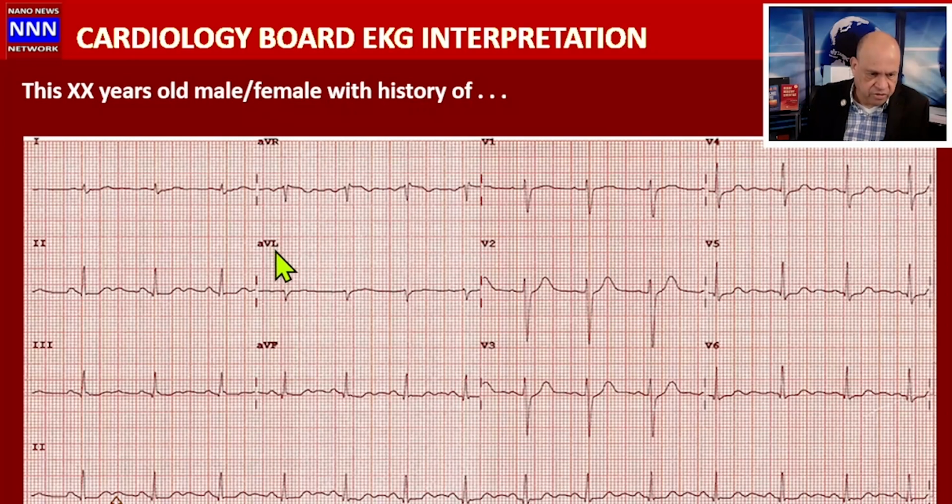All right, let's look at this. Here we have a sinus rhythm, and there's a little bump here. It's not bifid T waves because these are prominent U waves. What are the conditions in which we see prominent U waves? The first thing that comes to our mind is hypokalemia, but there are a lot of other conditions that can cause U waves. Do we see anything else in this electrocardiogram? There's a low voltage here, but not in the rest of the leads. The anterior region looks okay, the lateral region looks okay, the ST-T look all right. So this is a case of prominent U waves.